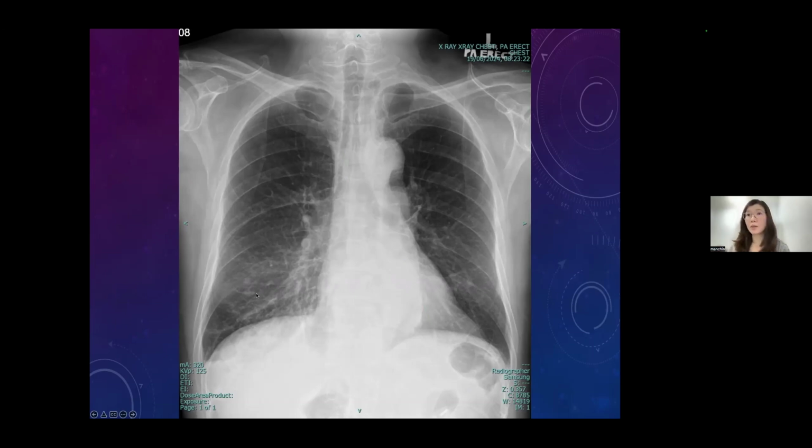Last time we talked about the nipple outline in our several X-rays, right? Again, the day I saw a patient, actually it's a nipple outline, but referred to a chest physician for a lung nodule. So remember, must look for it. If not sure, repeat the X-ray with a nipple marker. Okay, come next.